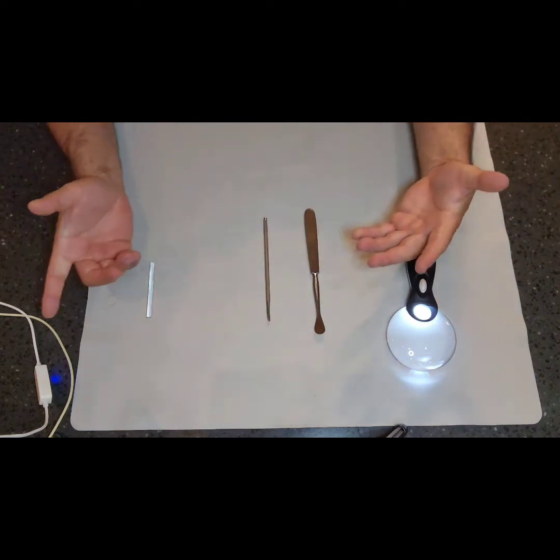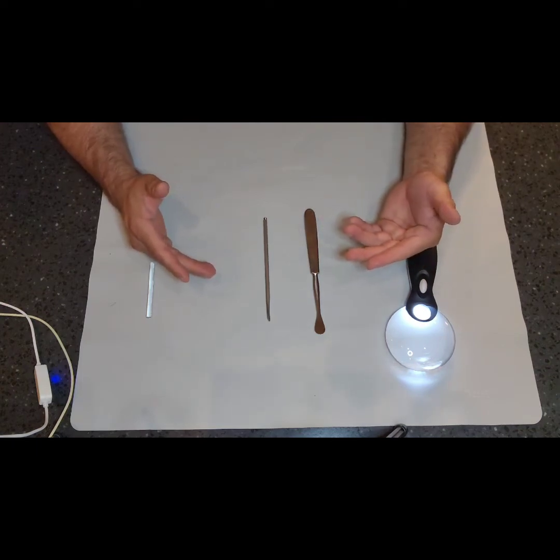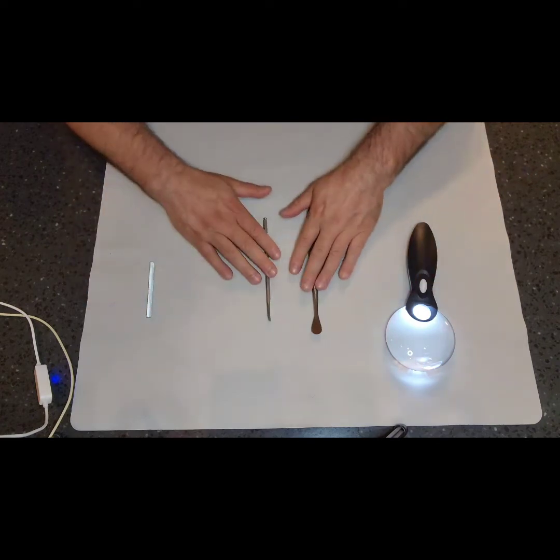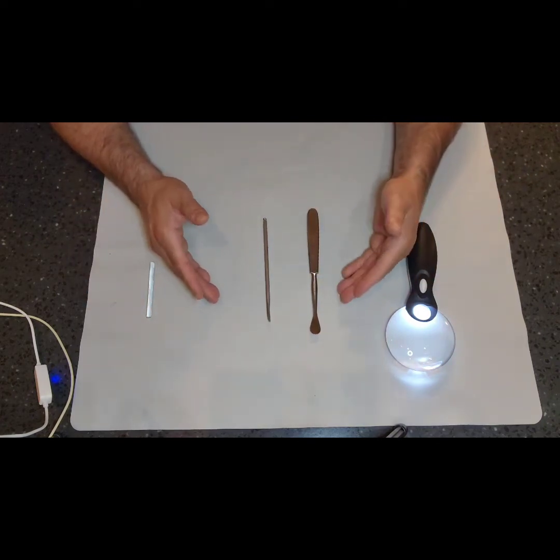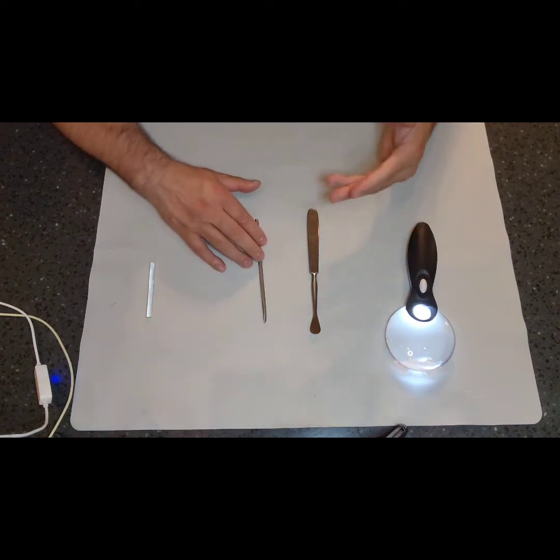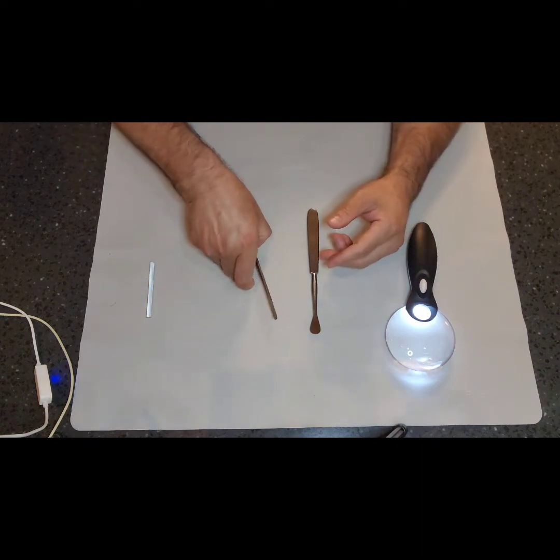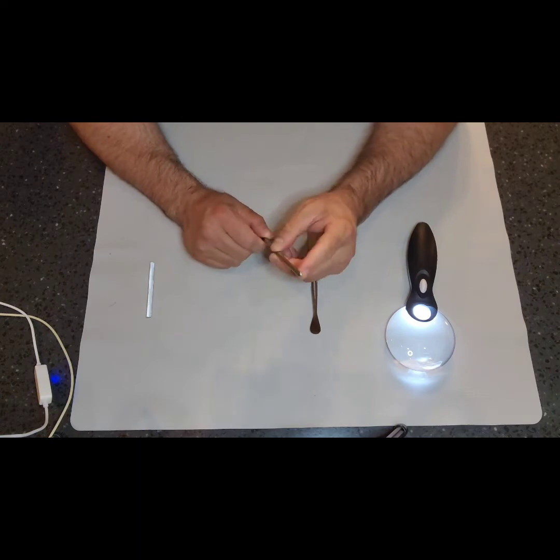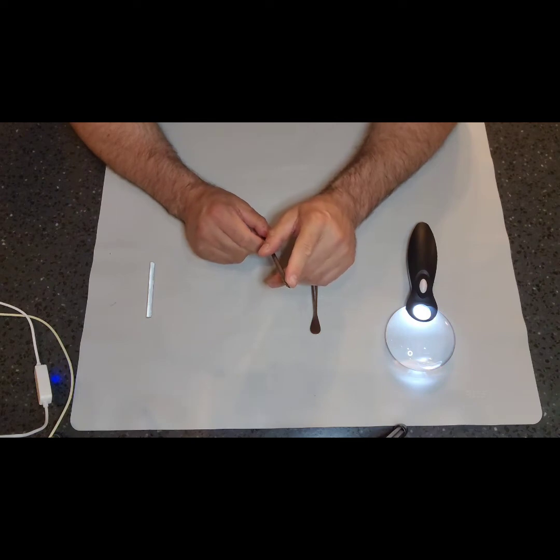But we're in prep and pack, so what are we doing with our surgical instruments? We're not ready to go take the skin off of a rack of ribs or a turkey. These are going to be used on patients, so we have to inspect for cleanliness, any damages, and check the function of it, right? Most elevators are one piece. This one actually happens to be a knife handle modified with a dissector at the end. It's a Cottle knife with a Cottle elevator or a Cottle dissector at the end.